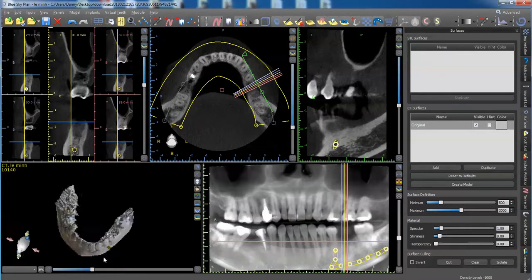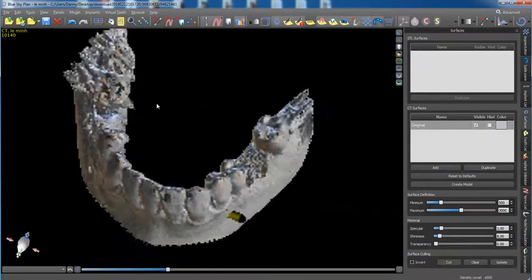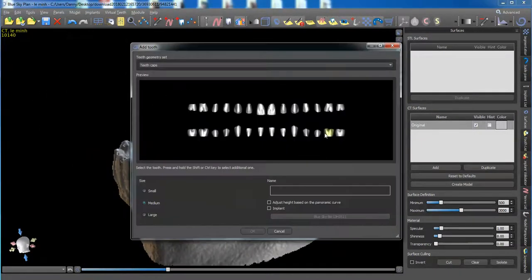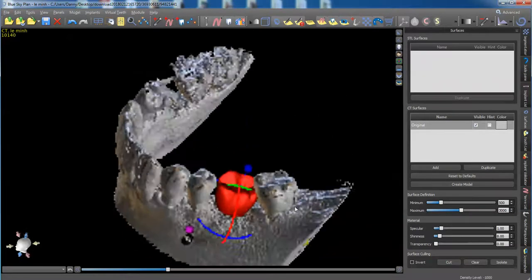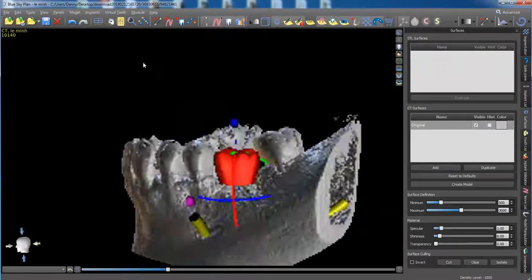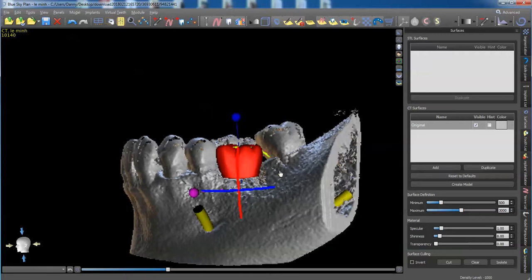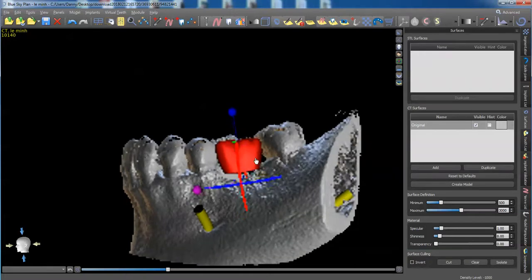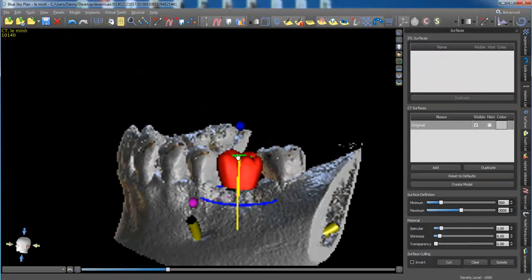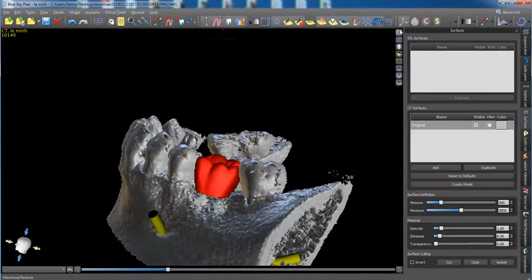All right, good. So what I'll do now is I'll add a tooth, number 19, medium, let's go large, pretty large space. Okay, good. That's pretty easy. Just kind of manipulate it till it's perfect. All right, get back out of this.